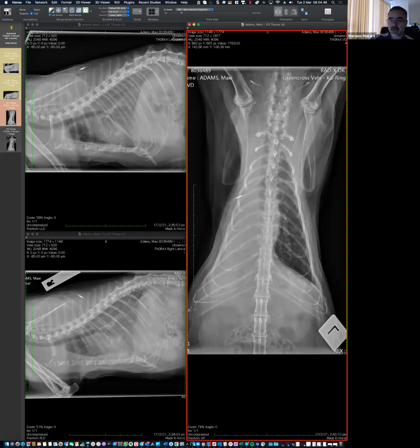As usual, take a minute. Again, you can open the link in your computer, play with the images, or just look at my screen. Then we start with the findings, and then we try to explain what is going on.